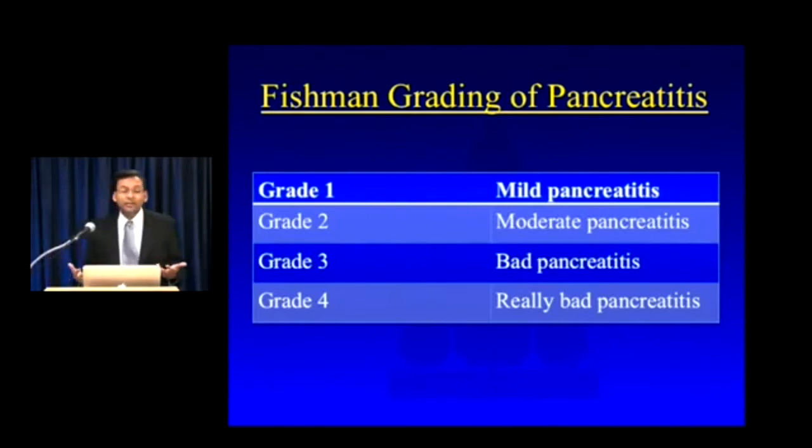So it's not enough in your dictation to just say the patient has acute pancreatitis, period. That is not a useful dictation. What is useful is to say, well, this patient has horrible pancreatitis with a bunch of complications, they have this and this feature, this much necrosis, and allow the clinician to paint a picture so the clinician can get a sense for whether this patient is someone who needs to go to the ICU and needs to be watched very carefully, or alternatively, is this one of those run-of-the-mill cases of pancreatitis that can go to the floor and is likely to be out of the hospital in a couple of days.